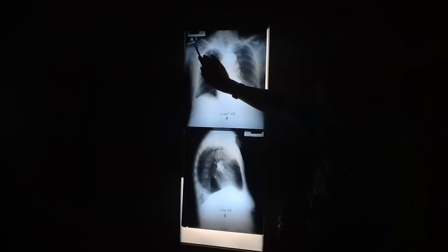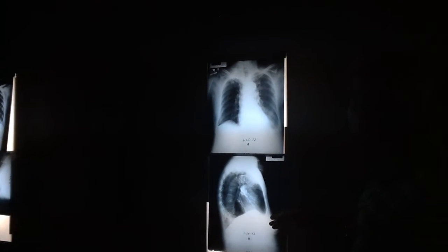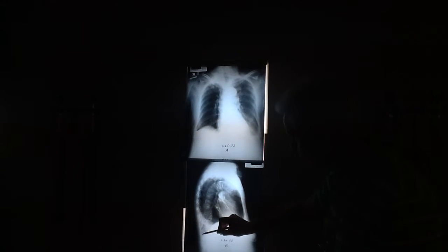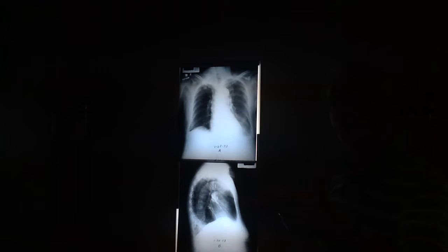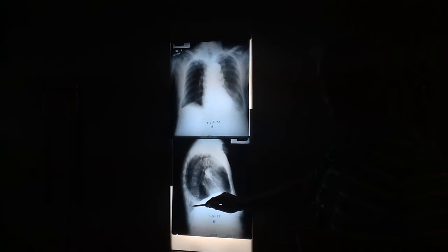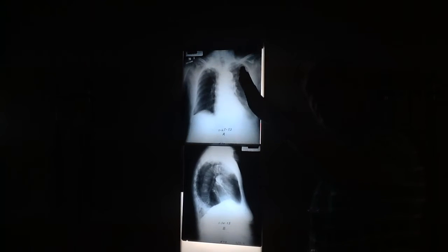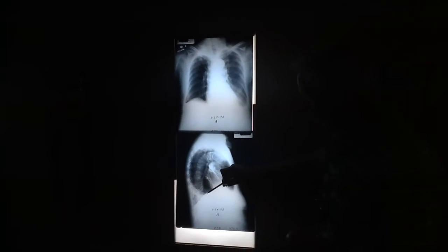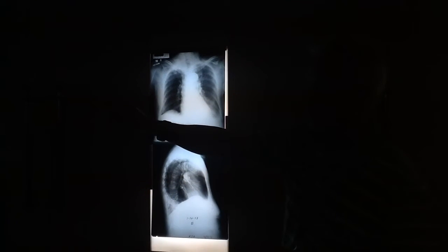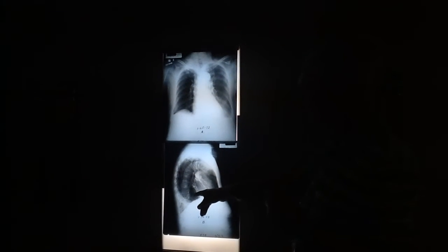This view was done recumbent, supine, same individual, 5 days later, upright. Now, see down here? Unilateral localized water density, posterior lung base. But it has a superior concave shape to it that looks like it's going up the chest wall. Looks kind of like a big meniscus, just like that one over there did. Only that one was much smaller because that was a small amount of fluid. This is a big amount of fluid.